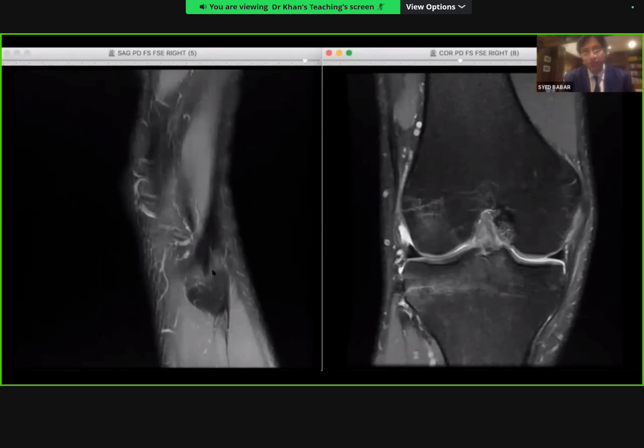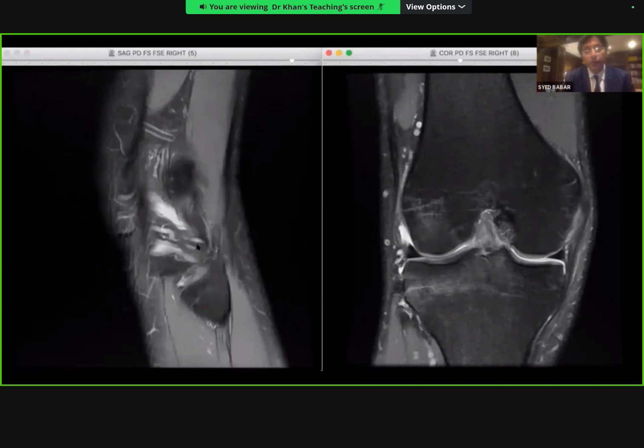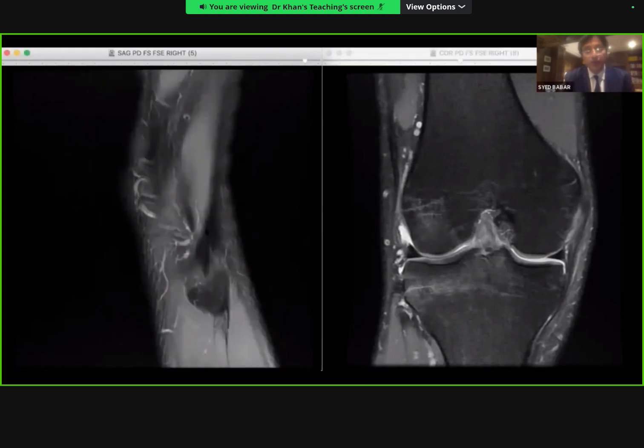And the first initial sequence from the lateral side, you'll see this dark structure. It'll be what we call a Bugs Bunny appearance. In other words, you see 2 black ears. So that's the biceps femoris, and this is the lateral collateral ligament, and you can see the fibular head.